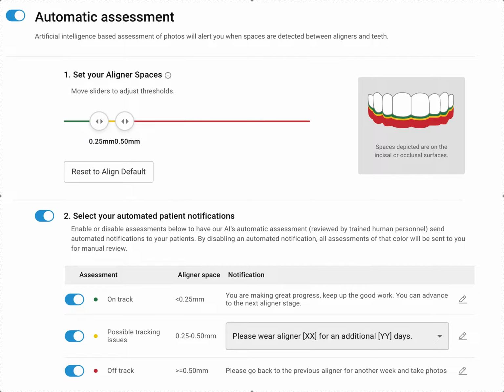And with Straightsmile Solutions, straightsmilesolutions.com, today we're going to be talking about how to set up your Invisalign Virtual with AI. If you want to see all my other content about Invisalign Virtual, you probably should watch that first because this is going to build upon that.